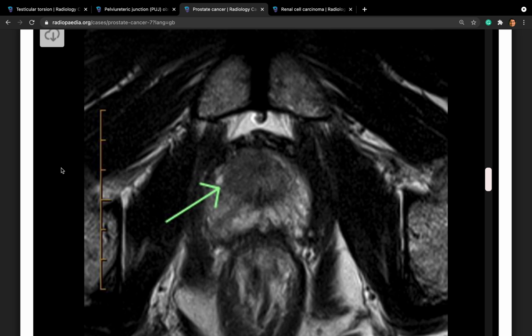Okay, so with these phases, how are you going to evaluate his risk? What criteria do you have? Radiologists use a system called the PI-RADS system, which stands for Prostate Imaging Reporting and Data System. Depending on the likelihood of clinically significant cancer, the lesion is given a score from 1 to 5.